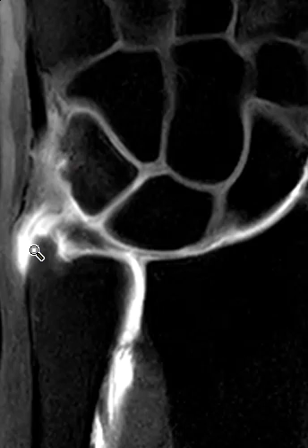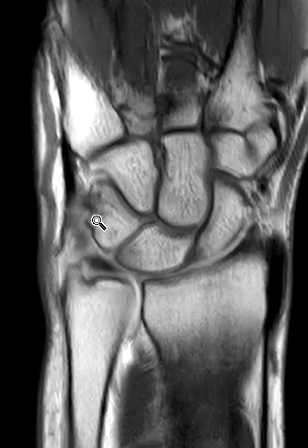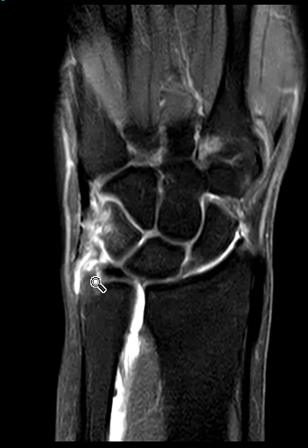The ulnar collateral ligament complex over here is torn from the triquetral bone here. The cortical irregularity you can see on this view as well. And this is sort of an unusual injury. I always look out here at these ligaments to see if they are thin or thickened, but here it's clearly thickened, clearly bony changes. So they've had a little avulsion, a cortical and periosteal avulsion injury over here, which again is pretty rare. And one last look at that. It's that marrow edema and cortical irregularity.